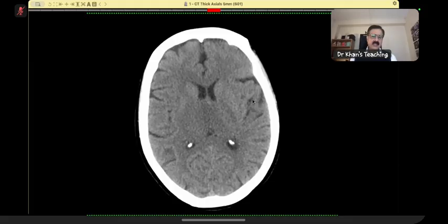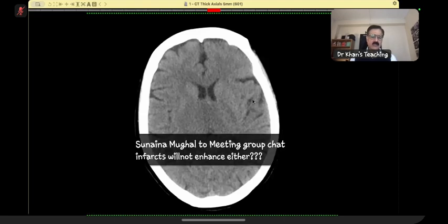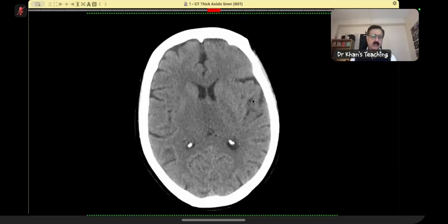Another thing with gliomatosis is that the radiological features will be much more than the clinical features, and there will be preservation of architecture. Remember that term, preservation of architecture. It will be a huge abnormality. In gliomatosis, sometimes five lobes might be involved, and if you look grossly, except for the signal, you won't find any abnormality.